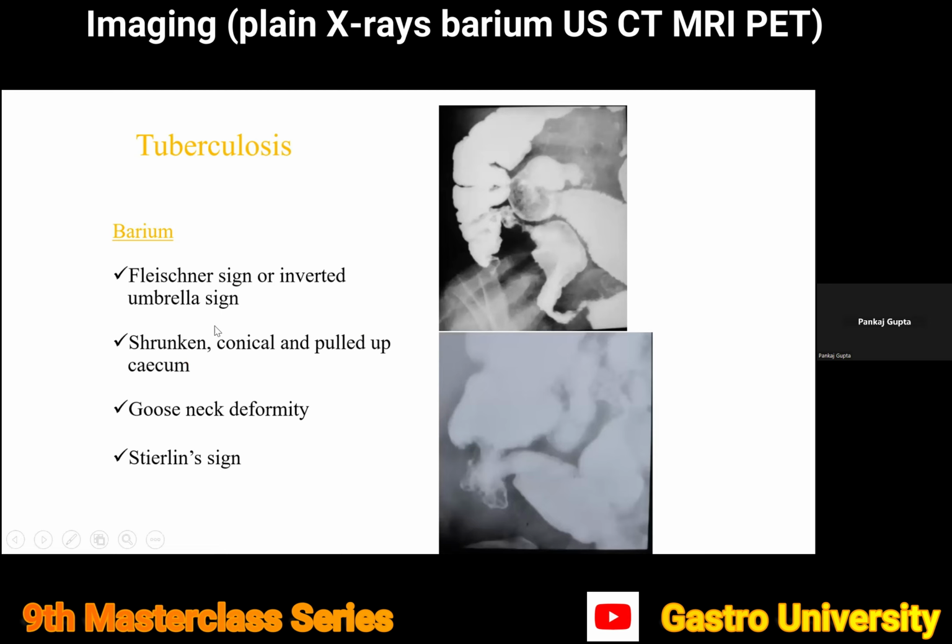But for students, historically, we had signs because of the changes in morphology of the cecum as well as the IC valve, leading on to different imaging appearances of the barium meal study. So here we can see that the cecum is markedly contracted and there is widening of the IC valve. Here we have a stricture and ulceration of the IC valve.